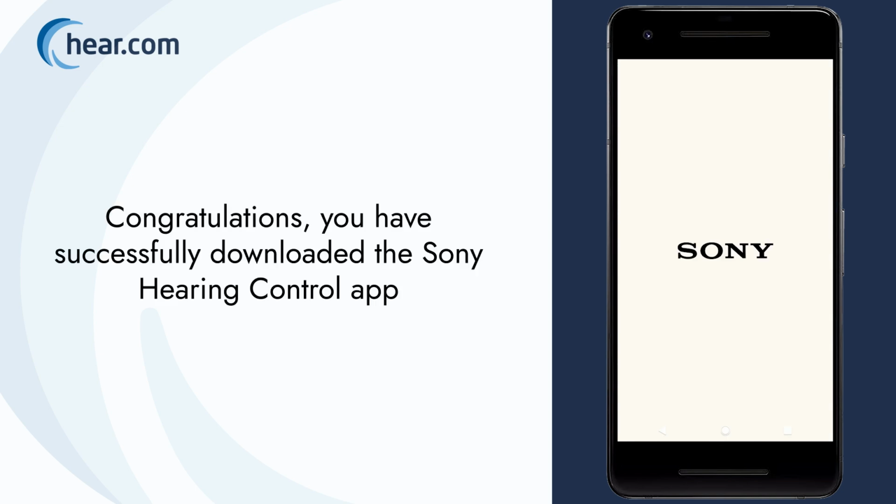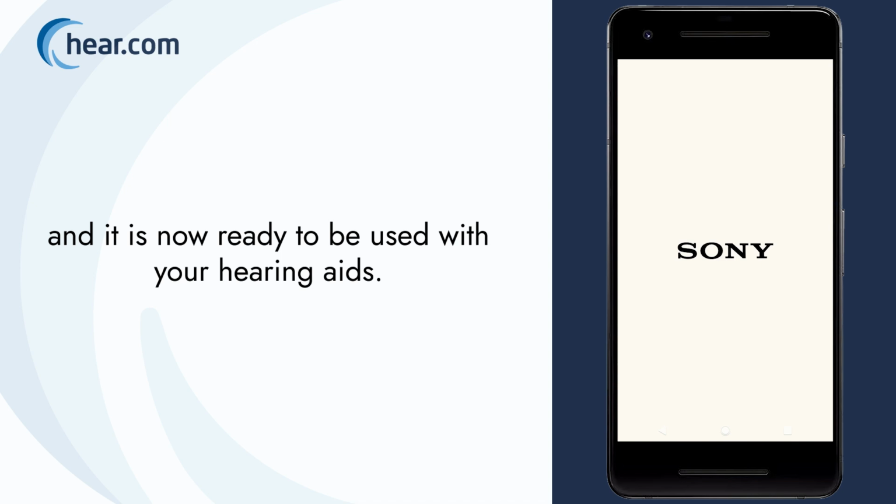Congratulations! You have successfully downloaded the Sony Hearing Control app, and it is now ready to be used with your hearing aids.